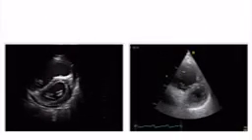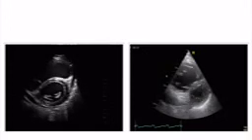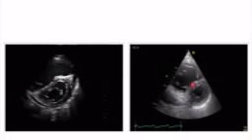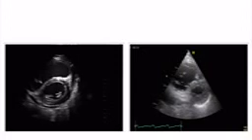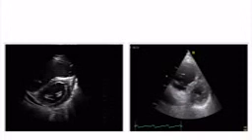Here are other examples. This motion towards the left ventricle can be less impressive. So here, for instance, in the example on the left, but still this paradoxical motion of the septum, as we call it. And also on the right side, we have this, but as you can see, it's not as pronounced. So the key message here is that the D shape can have all sorts of, I would say, severities. It can be very discrete, but it can also be very massive. And it correlates quite nicely with the pressure in the right ventricle, but not always.